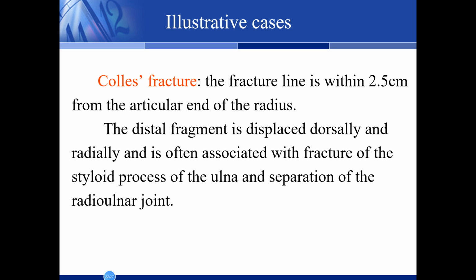Illustrative cases. One is Colles fracture. The fracture line is within 2.5 centimeters from the articular end of the radius. So this fracture we call Colles fracture.